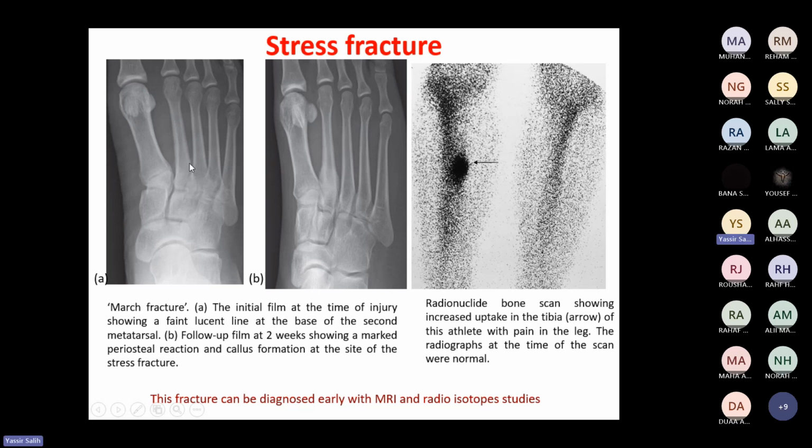Right here, exactly here. There is a very faint line. It can be missed easily in this region.